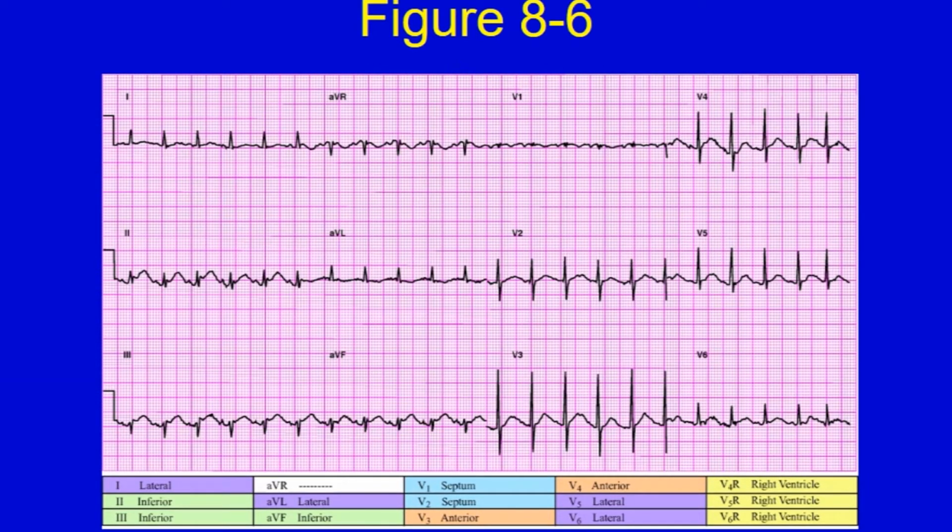2, 3, and AVF have ST segment elevation in them. I'm not going to tell you there's a whole lot there, but it is there. And you kind of have to look for it a little bit, but it does exist. Okay?